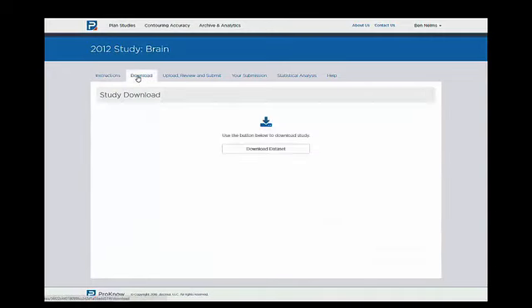When you've gone through the instructions, now you're going to download the data set. When you click this, it will download a zip file where all of the CT images and the structure set file are part of that zip. When you get that zip, you'll save it, you'll unzip it, and the source DICOM images that were inside of it you will import into your planning system.